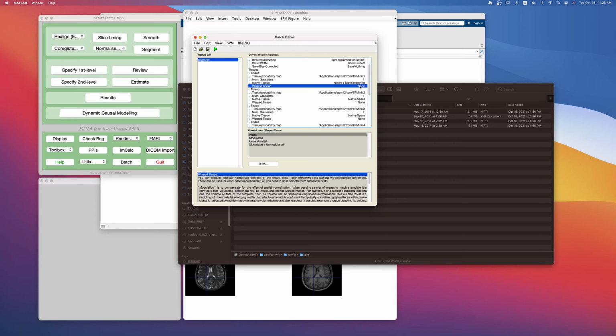All right. Technically, we don't really need this, but it's my habit to just collect everything and generate everything anyway. So we're gonna do modulated and unmodulated. The difference between modulated and unmodulated is described here, and you can read it in detail. But the summary is that if you change the shape of the image, then you have to determine how to account for the fact that the shape has changed.